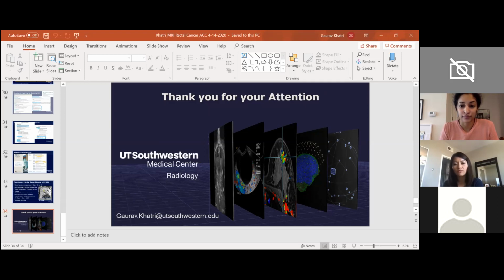So what I'll say is, if I'm favoring T2 or T3A, I might favor the T2 and just call it a T2 and say this is full thickness T2, knowing that the only way I will find out if I was wrong is if this patient goes straight to surgery, and also knowing that that patient in other centers like in Europe has the same survival, maybe better in some cases, as a T3A tumor treated with chemoradiation. So I'm not sure if that's the right thing to do.